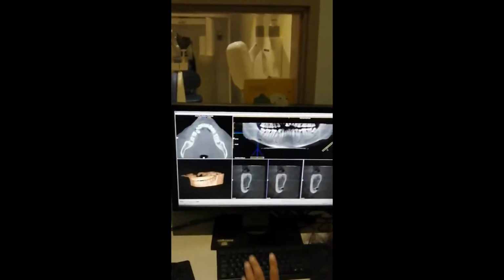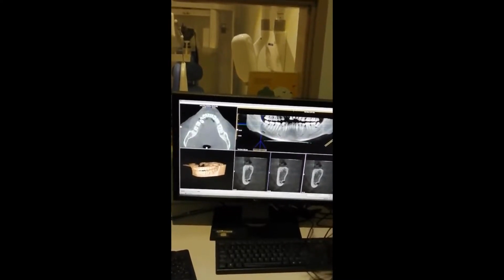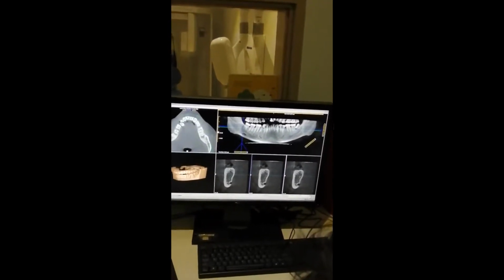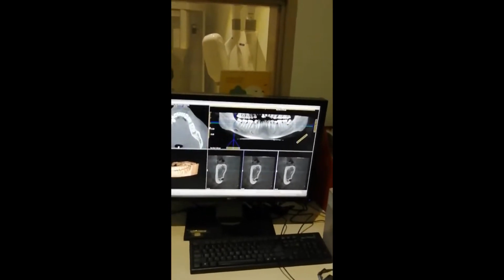So we don't have to worry about that now. This black area, I think it is an opening. The lingual... No, it's not the submandibular fossa there. But a fossa won't be open like that.